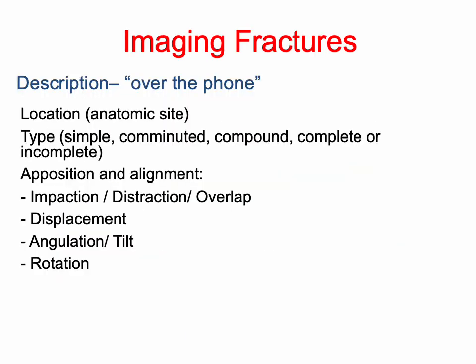Like I said, the hope today is to be able to describe a fracture to someone like you were describing it over the phone. Specific things you need to talk about are what bone it's located in, where in that bone, and what type of fracture it is.